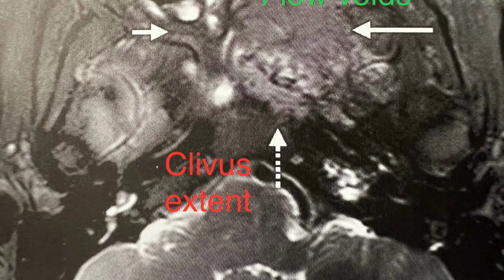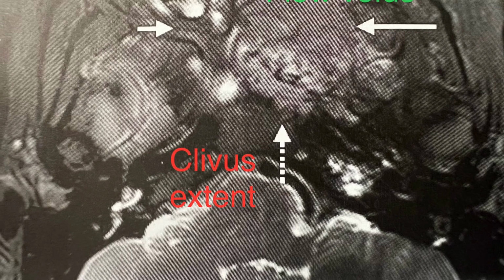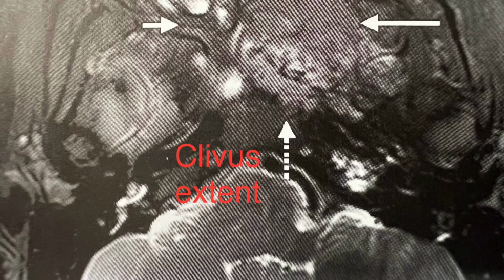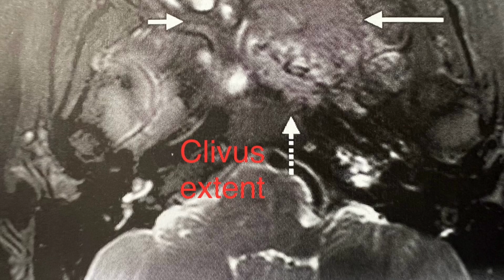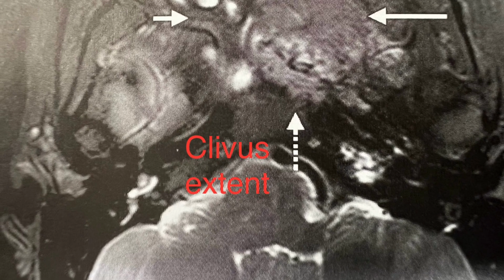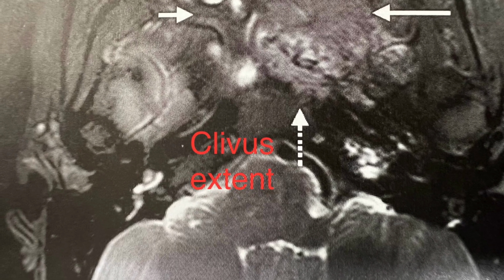You can see it in the long arrow, and it is invading the sphenoid sinus and clivus posteriorly. This T2 weighted MRI also differentiates this tumor from mucosal thickening and secretion, and you can compare the opposite side. You can see the opposite normal appearance of the pterygopalatine fossa.